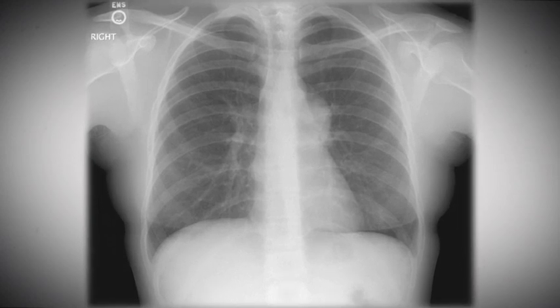On the frontal chest radiograph, there is a bulge coming off the left mediastinum in the area where the concavity of the aortopulmonary window is expected. A little bit of the aortic knob can be seen, and the normal left ventricle and right atrial contours can be seen. However, the pulmonary outflow tract cannot be seen. Therefore, the bulge coming off of the left mediastinum needs to be explained.